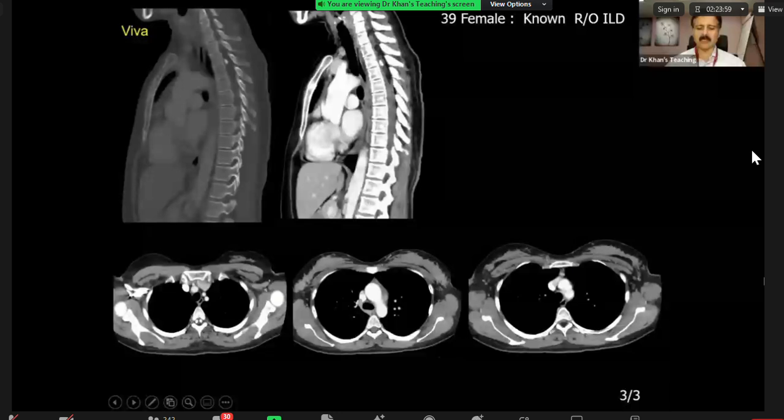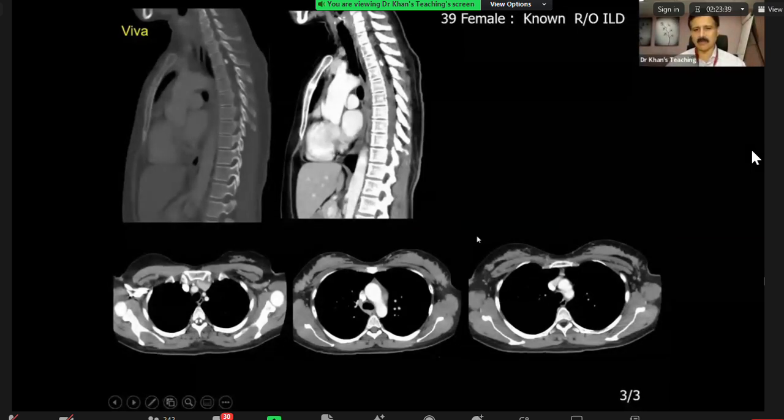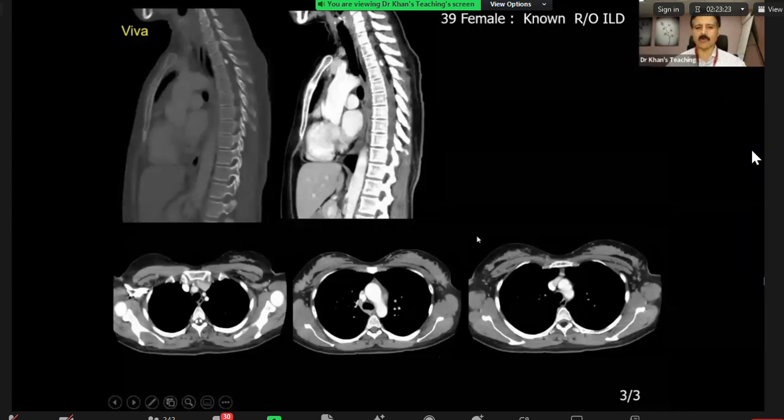But now what you have learned, a sort of review area, is that on a CT scan you look inside the spinal canal. And please remember, they have shown a case of diastematomyelia on a CT scan. If I show you a diastematomyelia on an MR, a child can pick it up. It's too easy. So that is what this exam is about: unusual presentation of a common finding.